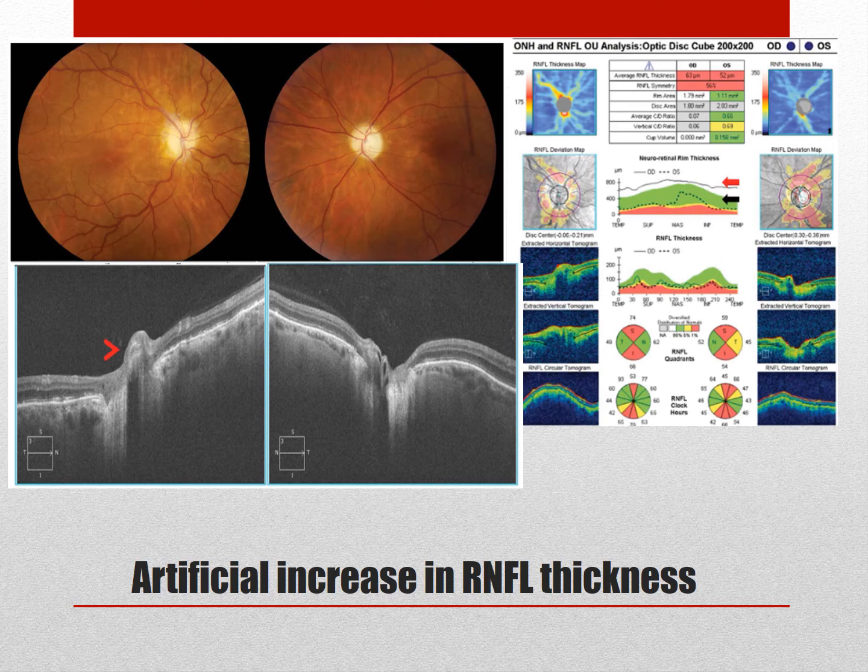What this is exactly is optic nerve gliosis. These are glial cells that have proliferated on top of the optic nerve. Usually when you have dead or injured cells, you'll see that proliferation of glial cells. Think of that as scarring tissue, pretty much, similar to ERM in the macula, a perfect example.